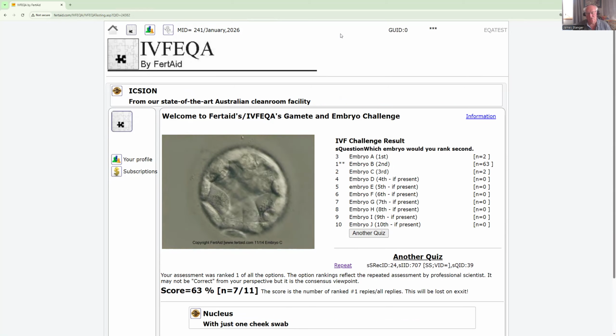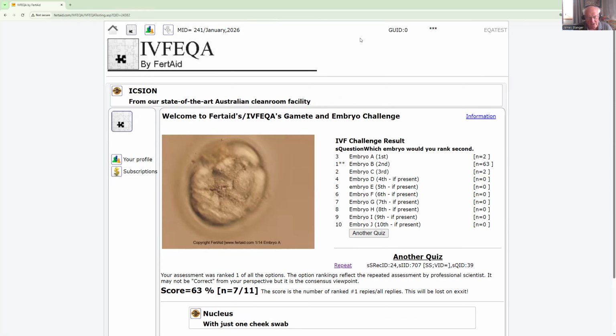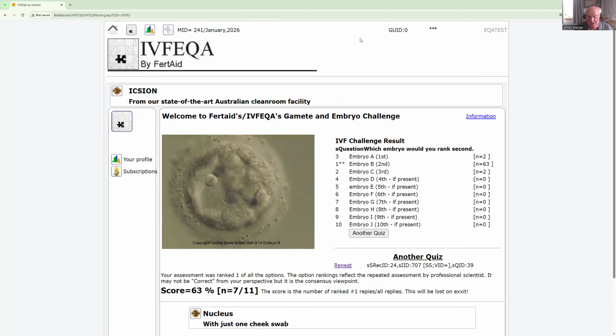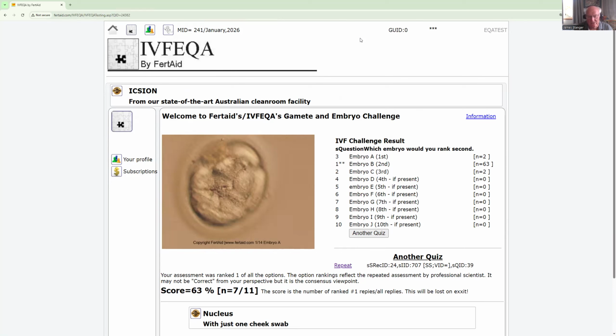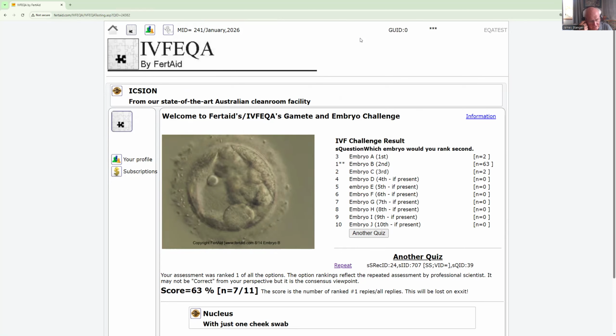Okay, I'm going to stop this because this is just a bit of fun. But the idea of the video was to run real life embryos and look at real life scoring in a dynamic sense. With the way I've done the video, you can take your staff out and ask them to do it, and you stop the video before I give you the results and ask everyone looking at the screen to make a notation of what they would do. And you'll probably find it's a bit of fun.